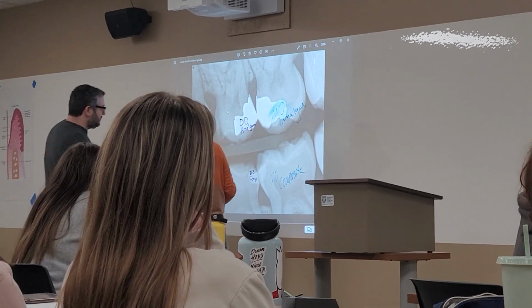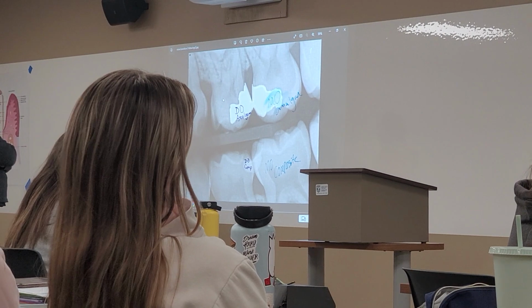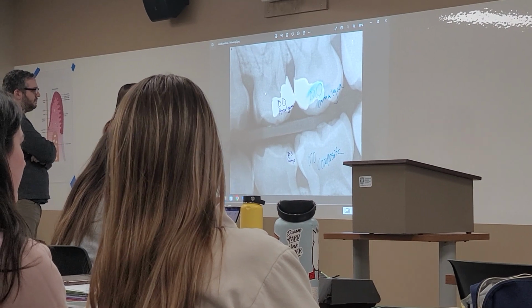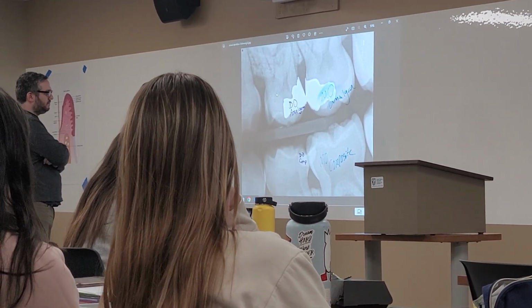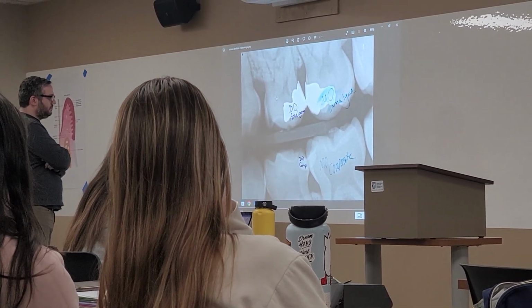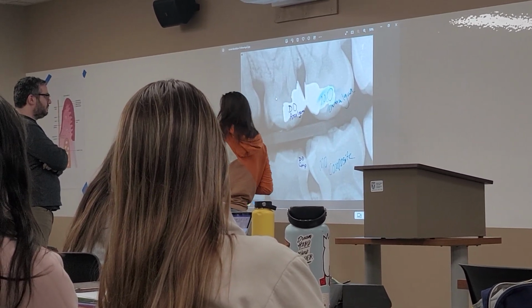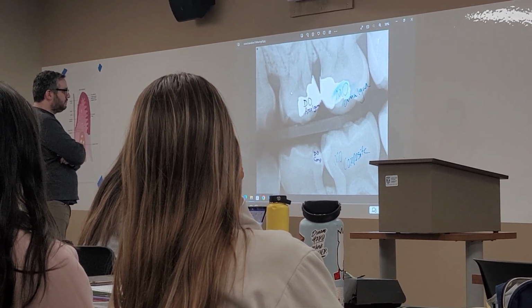When you look at them, do you have any concerns? Can you come up with an explanation as to why they have restorations? Baby teeth? Maybe these have been more open like that at one point. With the fillings, yeah. What else about these teeth looks a little different?